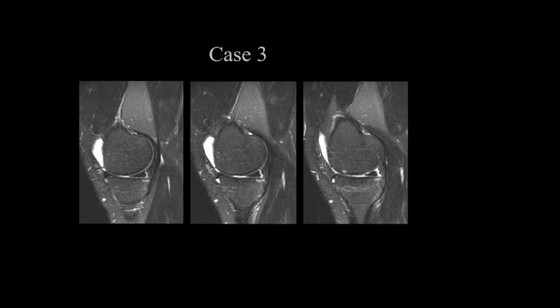Yeah, do you know the term for this tear, this meniscal tear? Do you know the name? Yeah, it has a special name to it. I don't know if you are familiar with it, but characteristically, this type of tear involves, do you know the anatomical name of this part of the posterior horn of the medial meniscus?